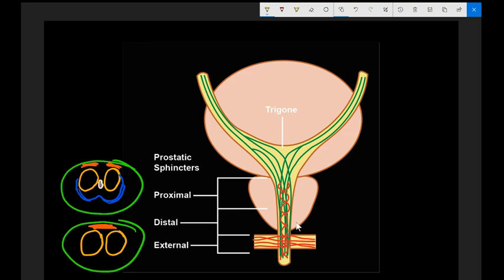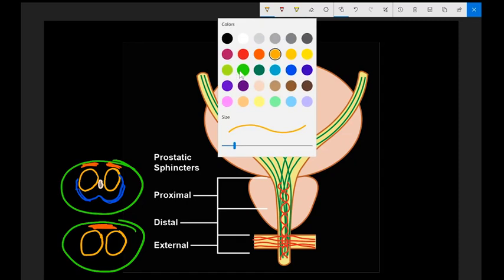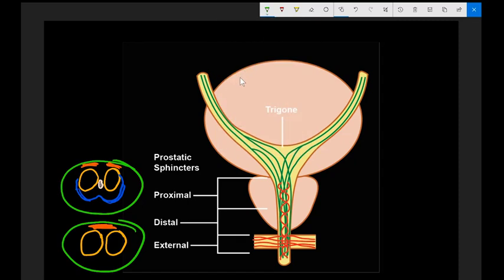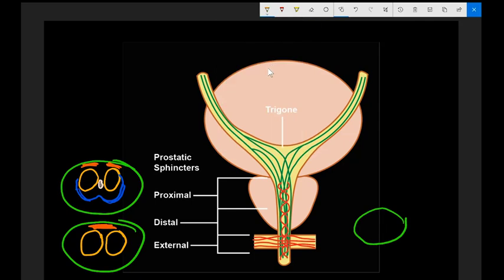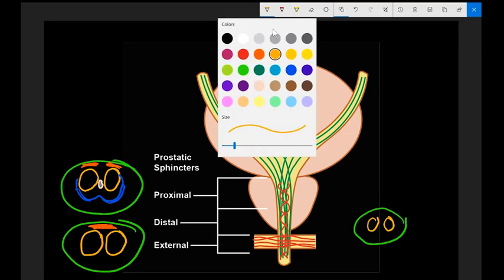All right, now we've got to go to the apical portion of the gland. See if we can get our green color out again. The gland's getting smaller because you're going down. That's no secret or surprise. And now the transitional zone is also going to be a little bit smaller, but you're still going to have a smaller TZA and TZP, which are front and back bisected right in the middle. You're still going to have a urethra with periurethral tissue.